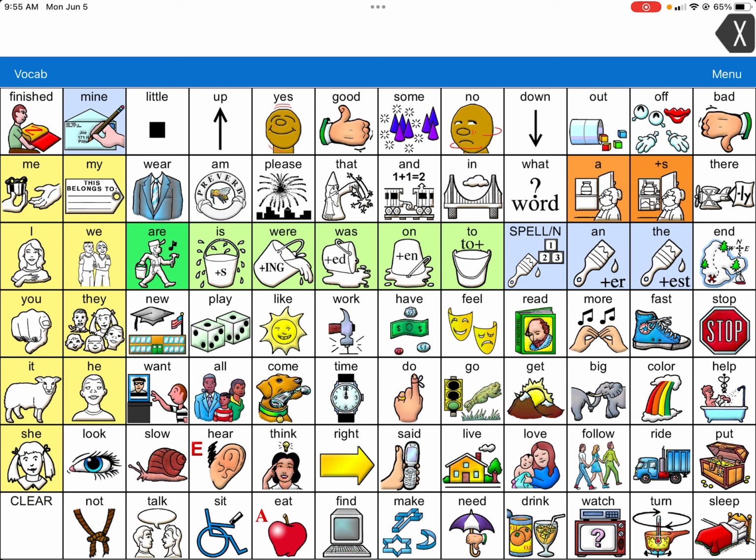So within LAMP Words for Life, you are able to do recorded speech, meaning you can record either your personal speech or like a recording of a song or a part of a show. This can be really important for our Gestalt Language Processors since prosody and intonation are very important in stage 1 and stage 2 of their development. And so if you're using LAMP Words for Life, this is a feature that you can use and can be really helpful. And so I'm going to give you an example of where you can program a Gestalt and how you would use recorded speech.